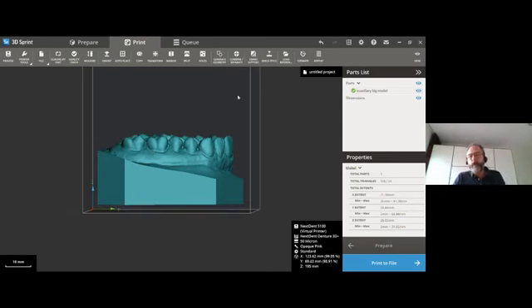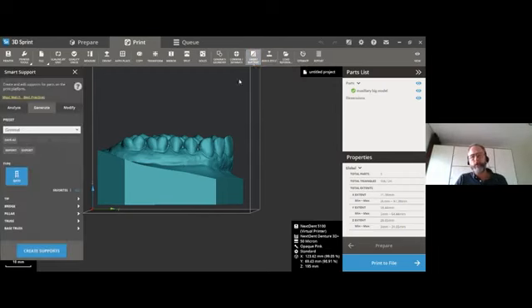That's a good question again. The main thing, if you use smart support, is that you trust smart support. So I would leave smart support alone, not change it, only if there is a support in a critical area like I just showed you with the surgical guide.